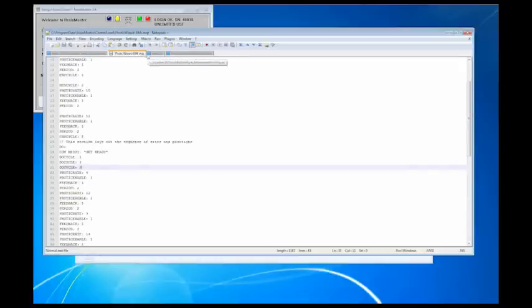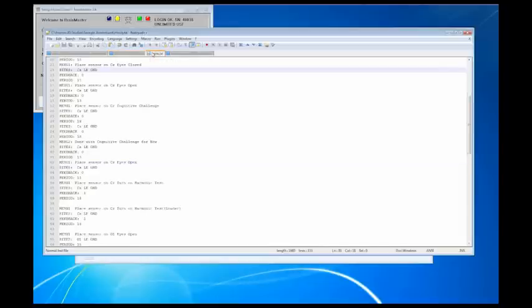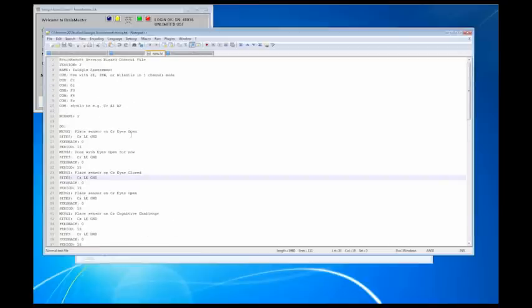Next, one thing I want to run into is actually another special kind of protocol that was built. And it was built for actually Dr. Paul Swingle and doing his 5-point assessment. As anybody knows, our Atlantis systems are only capable for up to 4 channels. So because of that, we actually utilize SessionWizard to basically do all the 5-point assessment and put in some of the different features into it by using SessionWizard to dictate where we're going to and how long we're going to it.